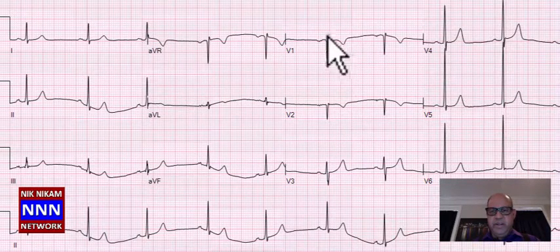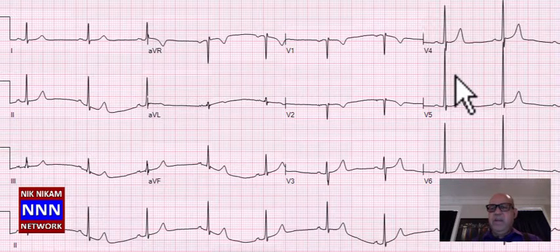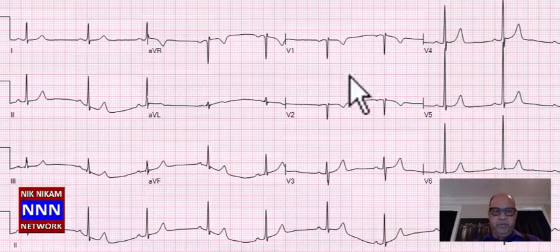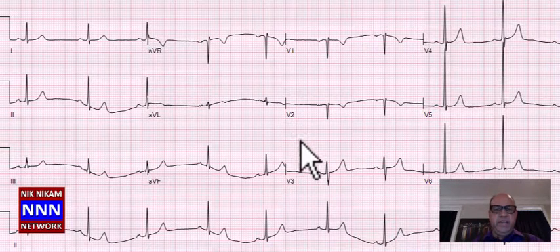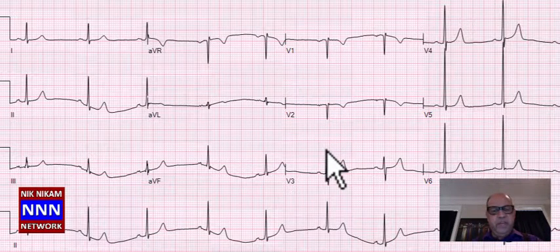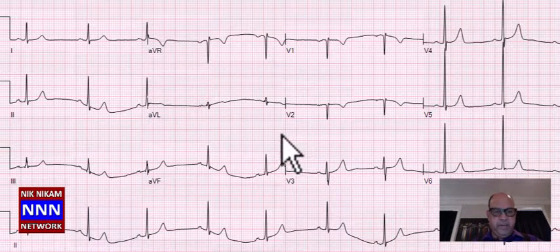All right, this is a sinus rhythm. Again, loss of R waves anteriorly, and also there is negative T wave in lead V1 and V2, along with some increased voltage in the anterior leads. If you have increased voltage in the lateral chest leads, the negative deflection sometimes may be related to left ventricular hypertrophy. But if you don't have any other criteria to suggest STT changes or left atrial enlargement or atrial fibrillation, anything like that, then you begin to wonder about, does this really represent an anterior infarct? There's no way to confirm that unless we do an echocardiogram or a myocardial perfusion studies to see if there was a previous myocardial infarction and a myocardial scar.